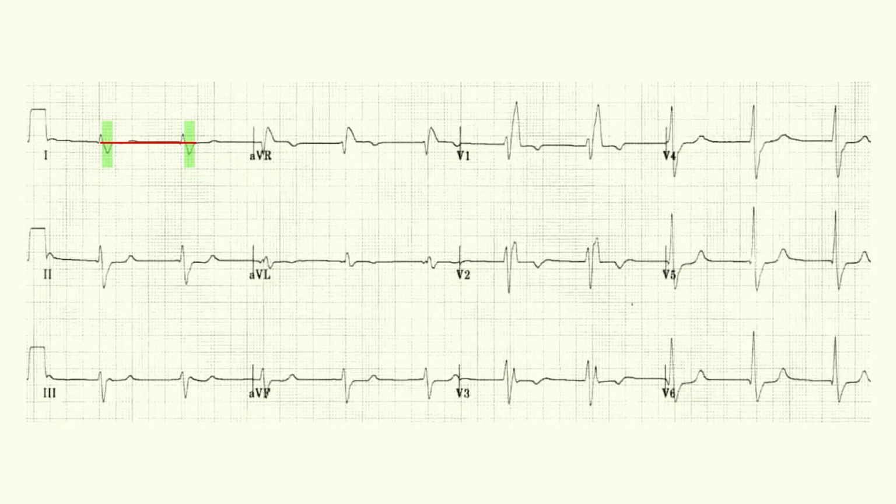It's traveling to the right. Lead 1 points to the left. Negative means it's going to the right. Okay, and then in lead V1, the terminal QRS, is that positive or negative? It's positive. So that's traveling in which direction? To the right. So that gives us concordant information. Both these tell us that the terminal depolarization, the blocked bundle, must have been the right bundle.